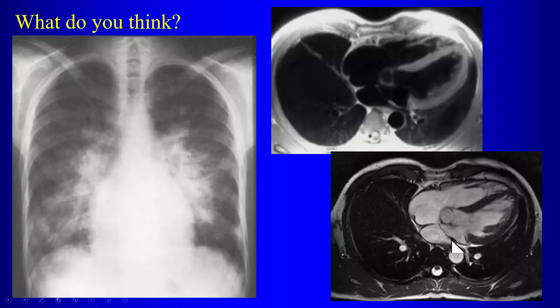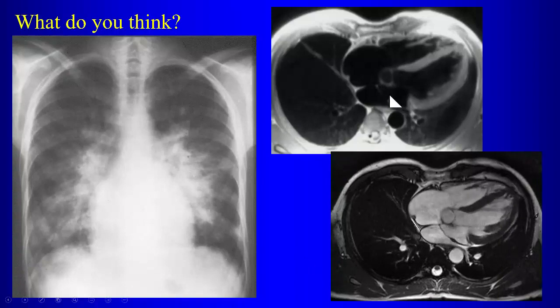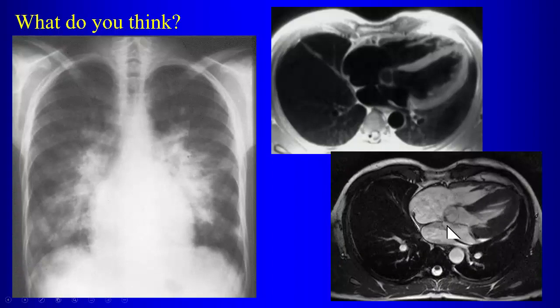No, that is not a jet from mitral regurg. That's fixed, you see? What? No. This is, say it out louder. Cor triatriatum. Cor triatriatum. So what does this represent? Septum.